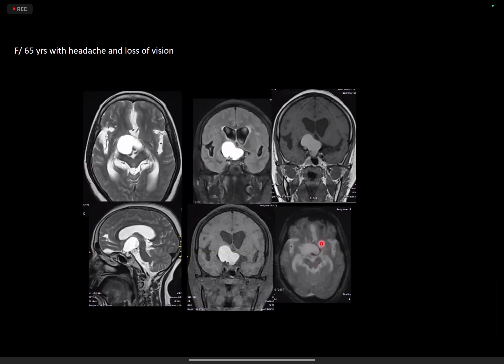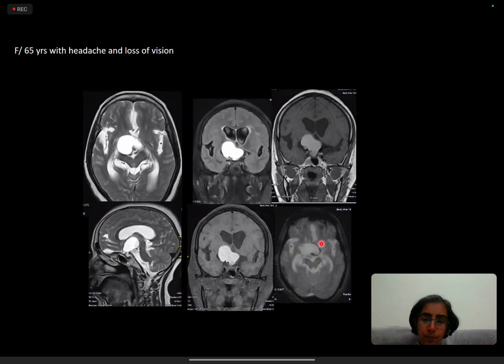Ma'am, there's blooming towards the periphery of the lesion. Yeah, most likely susceptibility, calcification. Blooming on gradient echo image. So anything that is hyperintense on T1 weighted images could be fat or could be other proteinaceous content. We know it is not fat because it is not suppressed on fat saturated images. Okay, so this is a craniopharyngioma, especially in this age group. It's quite likely.